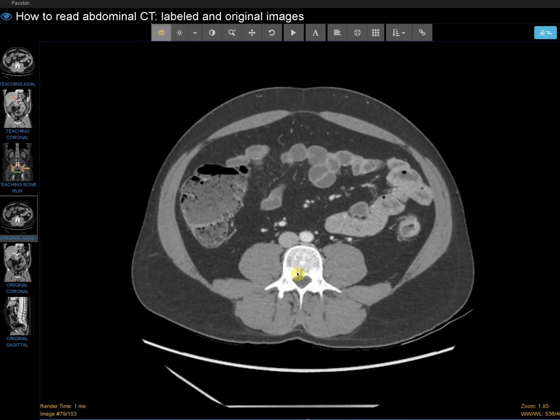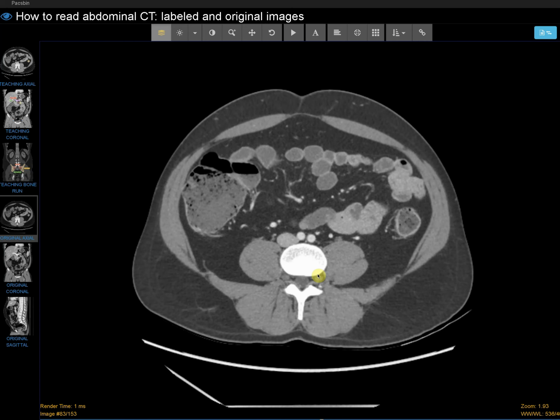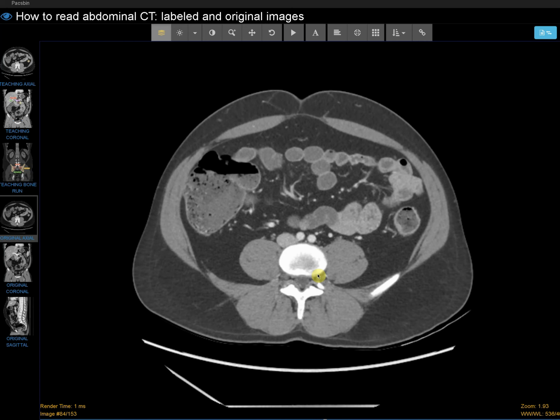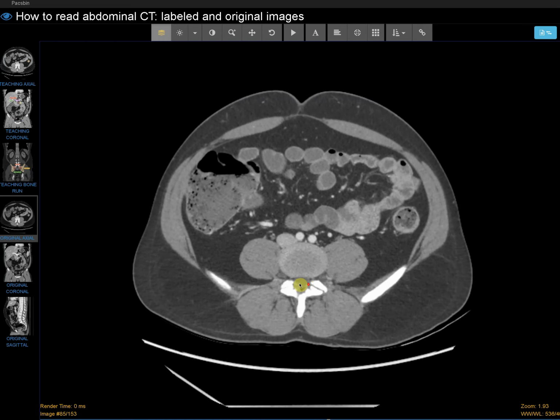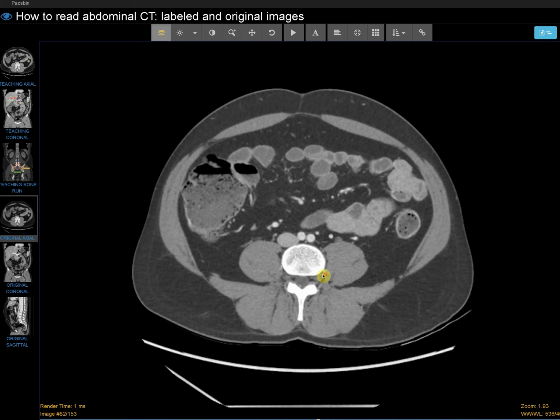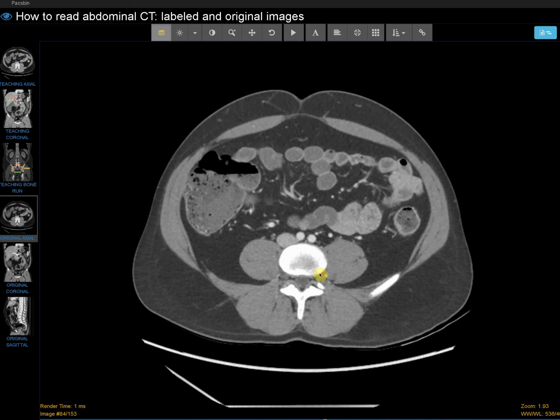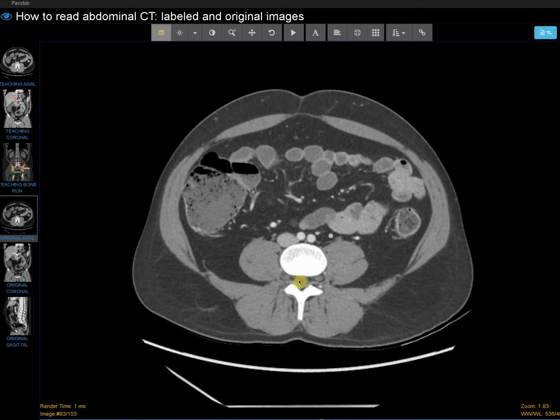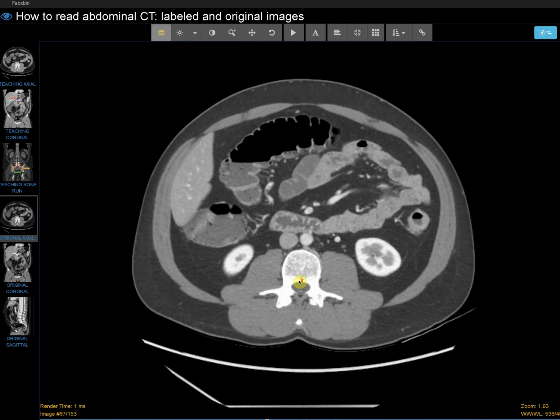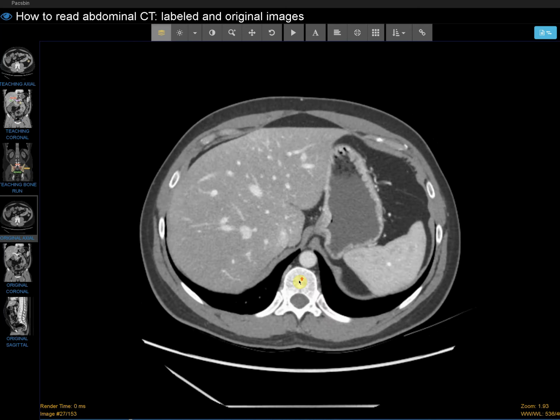And so I'm at the bone level. But if I go down here, the disc protrudes out a little bit. See how the bone is sharp at this level, but if I go down here, the disc has a bigger footprint than the bone itself. Now, a little bit of that is normal, but if it's a lot, then you can have broad-based disc bulges or herniations. So that's something we can look at as well.